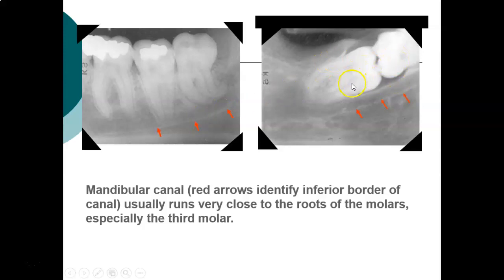These are some crazy impacted teeth. That is just as sideways as you can get. And this is the second molar, I believe, which is just as impacted as the third. So that's definitely a hard situation.